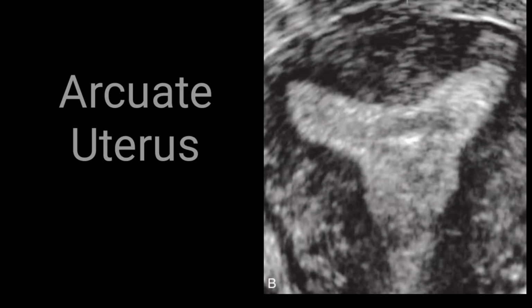Well, it depends upon the indentation. If the indentation is more than 1 centimeter, it will cause a blockage within the uterine cavity. Otherwise, here you can see there is sufficient space for the uterine cavity. Endometrial thickening you can easily see, the internal area is also visible, and on both sides the myometrium can be easily appreciated. So this is an arcuate uterus on three-dimensional imaging. Certainly this image will explain how a septate uterus looks.